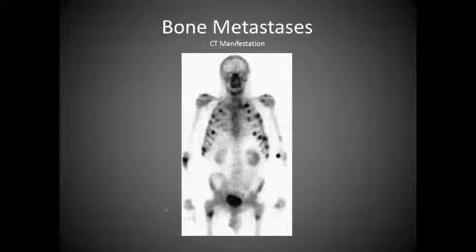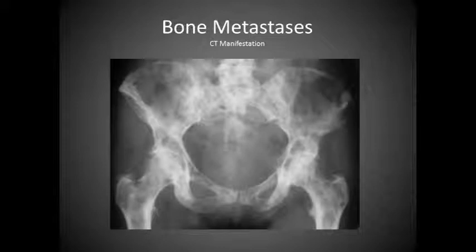So here we have a scan and all the patient's hot spots. We have radionuclides in the bladder, but we do have a hot spot here, here, here, here, here, here, here, here, here, here. And so if we'll notice, this is potentially all areas where the patient could have mets.